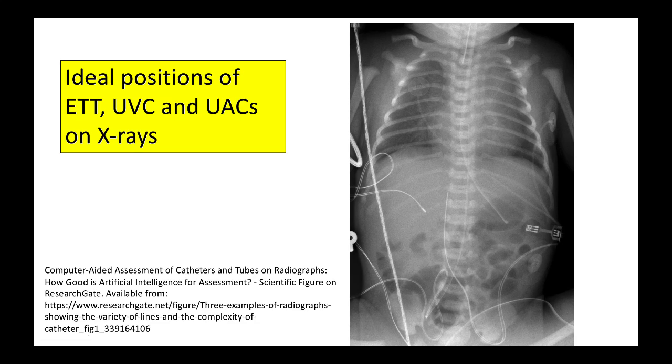Today we're going to be talking about the ideal positions of neonatal lines and tubes on x-rays. Stick around to the end because I'll go over some trickier x-rays to test you all and make sure you've absorbed it all.